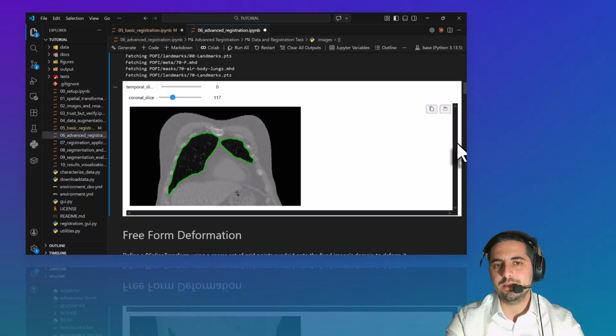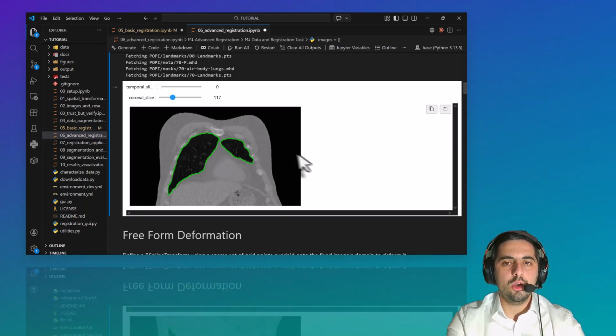It's not exactly like that. We are going to recompute the gray intensity for each pixel, and this is called the transformation applied. The same thing here: what we want to do is compute the gray intensity for each voxel based on the non-rigid registration.